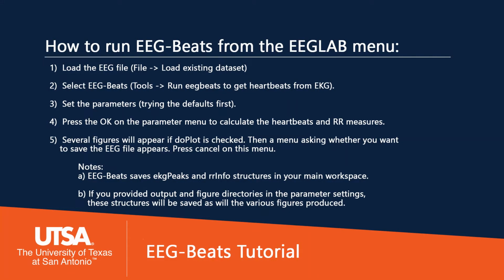Now I'm going to show you how to run EEG Beats from EEG Lab. This plugin has a simple user interface for running EEG Beats on a single dataset. First, we have to load the EEG dataset we want to use. Then we bring up the EEG Beats GUI to set the parameters. Once we are satisfied, we press OK.